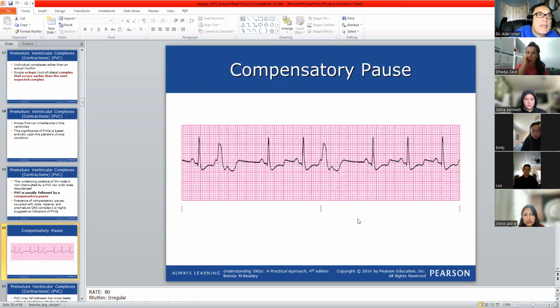Of course, let us count how many. What is the first item? The heart rate. What is the heart rate here? 1, 2, 3, 4, 5, 6, 7, 8. You got it? You agree? Okay. What next, Diana? The heart rhythm. Very good. And it's not the same, so it is irregular. Correct. Keep going. And then it's the P wave, right?